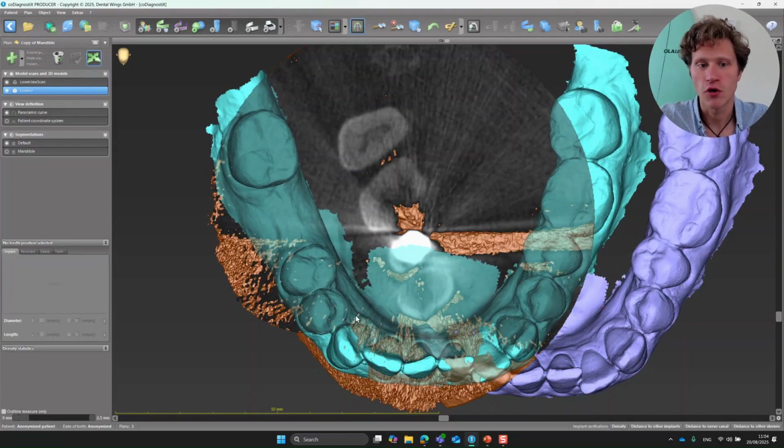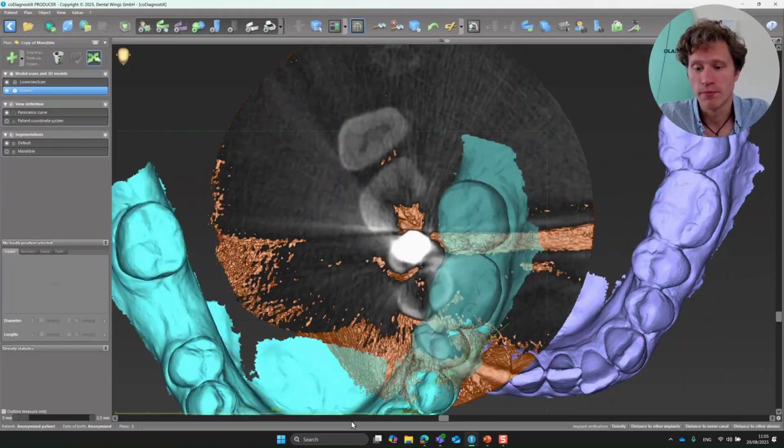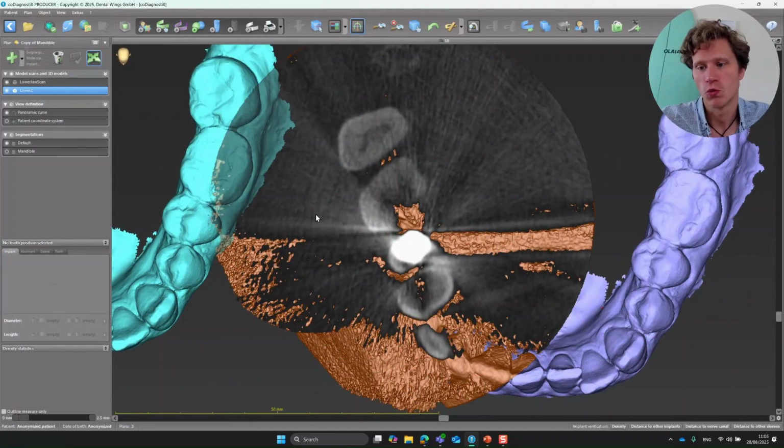Is it better? Of course, yes, because we will have more teeth for alignment, because we need to have a triangle for good alignment. So the first mistake is putting the patient in the middle. But the bad thing here is also that the patient's teeth will be close to the border of the quadrant, and it's better to have a little bit more area. But anyway, even if you have this area, it will be much better than putting the patient just like this, because you will not reduce your dose, but you have more issues when you make alignment.